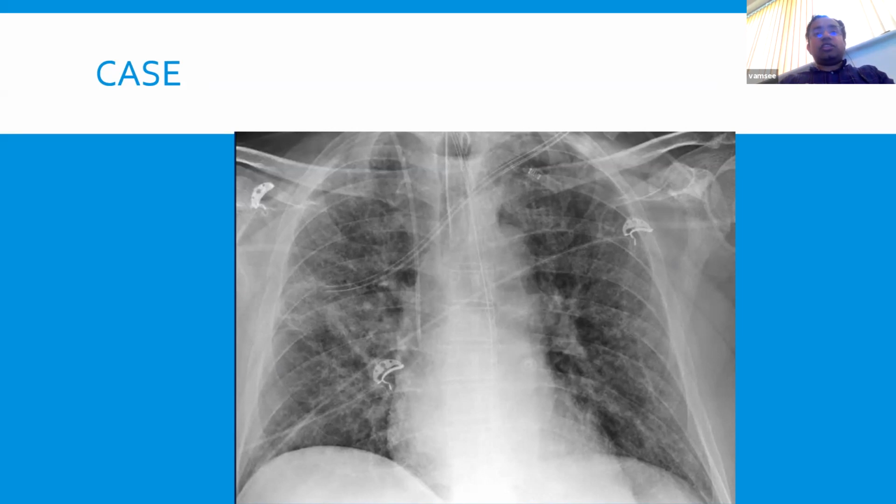This patient is intubated. You can see an endotracheal tube ending there. Bear in mind, endotracheal tubes are meant to end superior to the carina, usually by a few centimeters. If they go beyond that, that is bad because you end up blocking one lung and you can get lobar collapse and so on. You can see the bottom edge of the endotracheal tube on here. Just bear with me, let me draw on here. So that's the endotracheal tube going along there, and you can just about make out the carina along there.